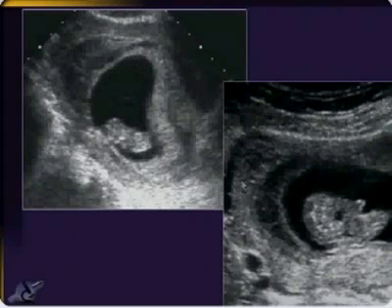You have to look very carefully on some of these because they can often be almost isoechoic. And you see this one, it's a fairly large subchorionic hemorrhage here, but several weeks later it's gone on to resorb, it's become more hypoechoic there, and this pregnancy did just fine.